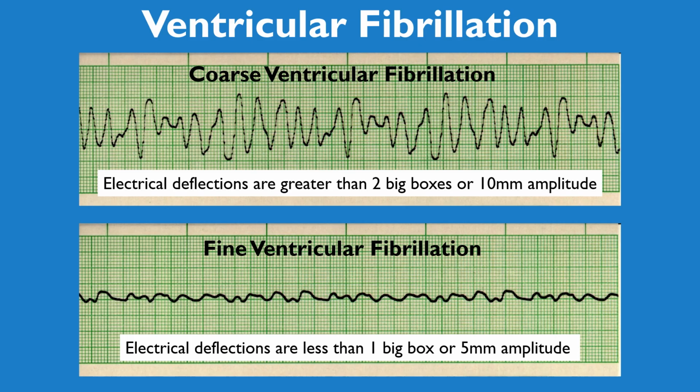We aren't going to be using the EKG Detective system on these specific rhythms just because they're the only rhythms that present with lack of any discernible waveforms.